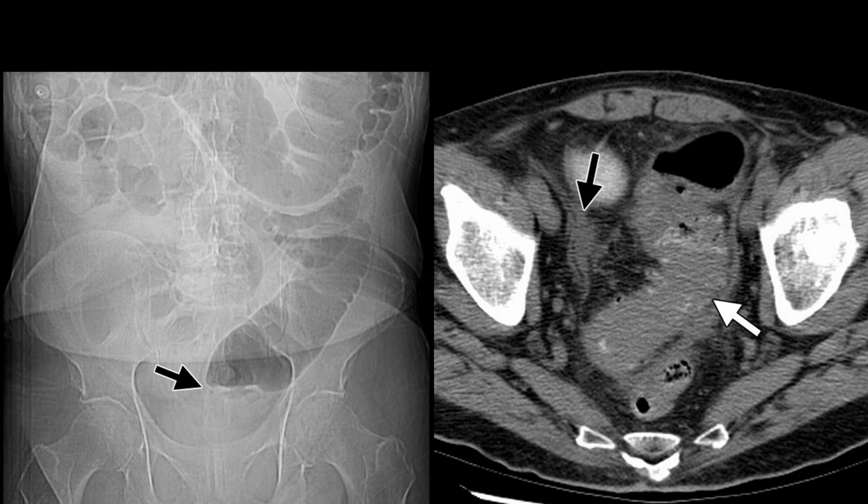inflamed mesentery or peritoneum, or with fluid collection around it. It's a diverticulitis causing obstruction. Usually we see this long segment obstruction in an inflammatory condition, unlike malignancy.